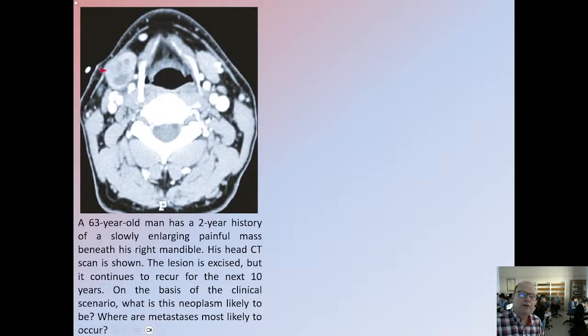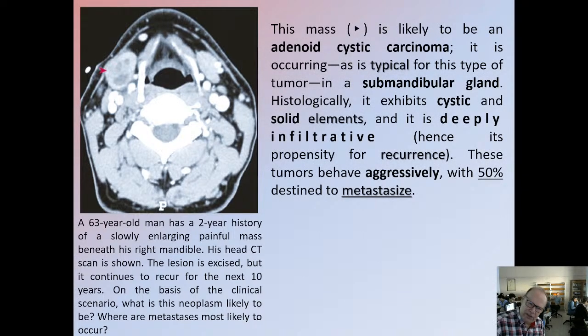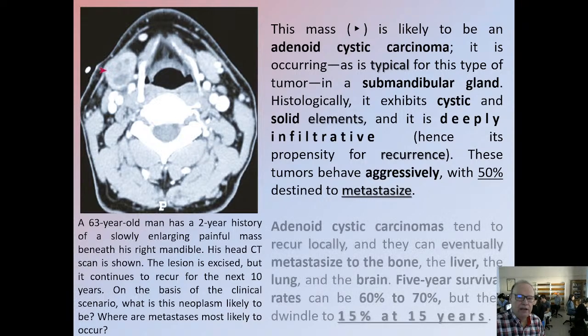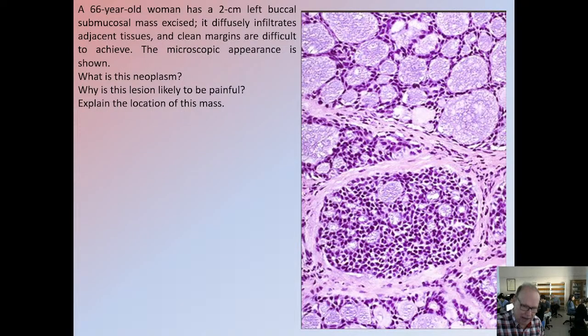Oh, here we have another tumor. It's a malignant tumor, and it has some cystic and solid elements as well. It is deeply infiltrative, and it can metastasize, and in that case, it will be fatal. Have a look at its cells. It's an example of a tumor where there is a sheep and it's a wolf.